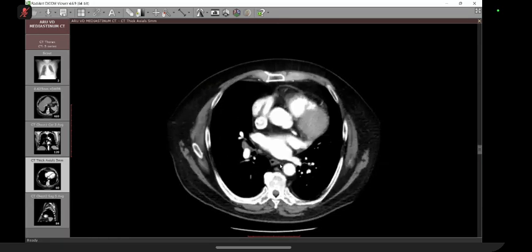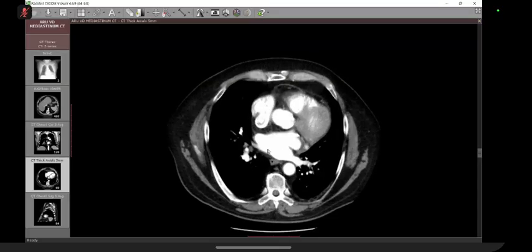So then let's continue with the esophagus. Now here we are still going down. Now there is a cardiac chamber here. Yes. Which one is this? Which cardiac chamber?